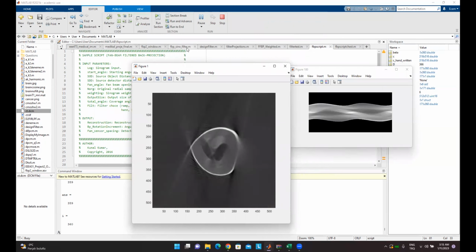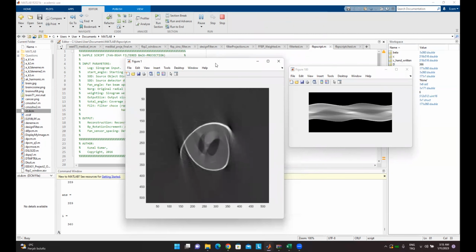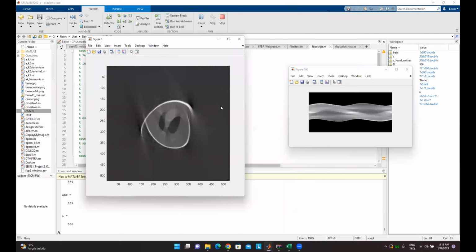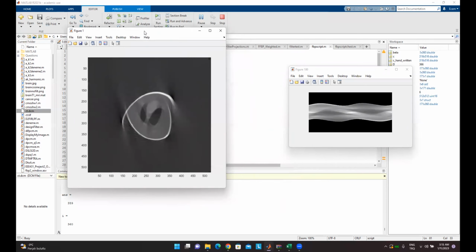And it is important to show that, for example, the external code was performed in blocks of code, which made its implementation very efficient. And here, as we can see, once again, the features became apparent in this image, so we can consider it a successful attempt in reconstruction. Once the whole reconstruction procedure is completed, we will be able to see the filtered back projection, in this external code weighted back projection, on our screen. Shortly, we will be observing it.